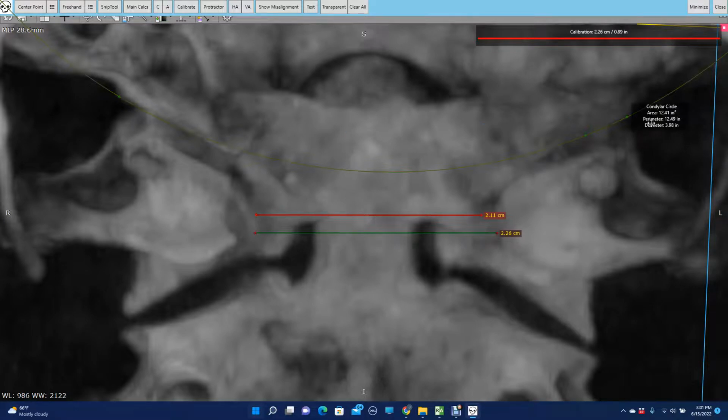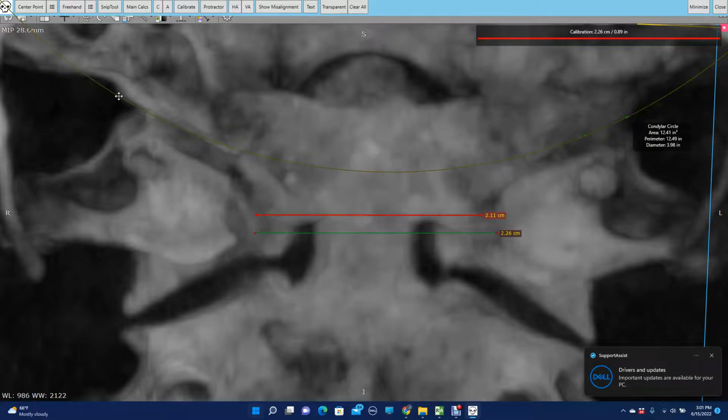And what you see is one green line, but if I tinker with this, you start to see more. Right? We'll see 2 circles that are in red and 1 circle that's in green. See if it shows up on the axial circle.